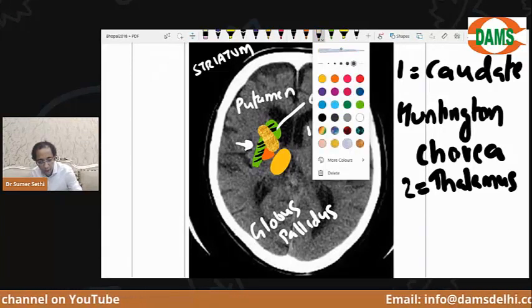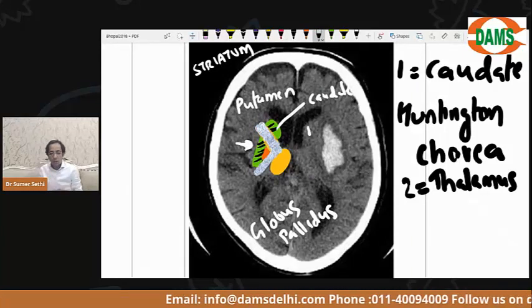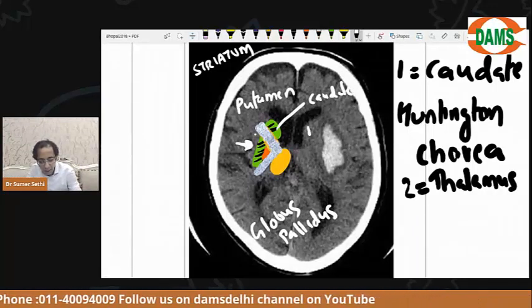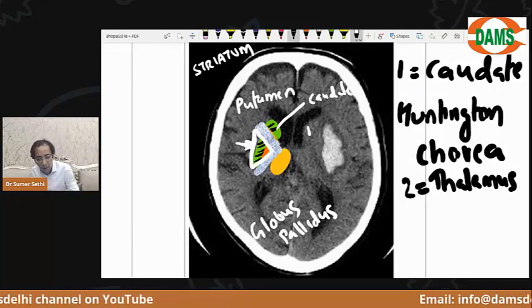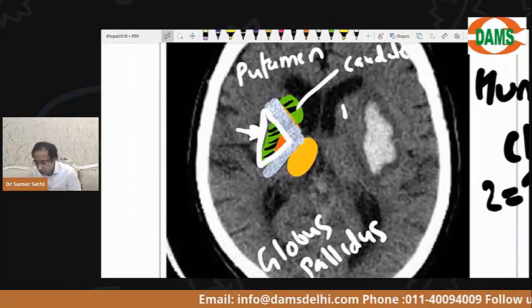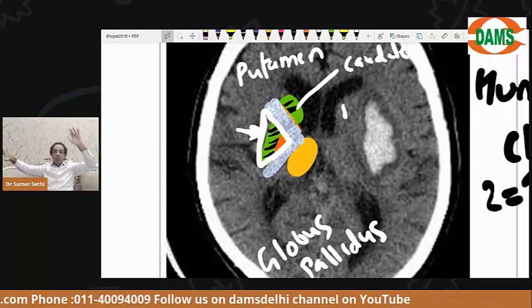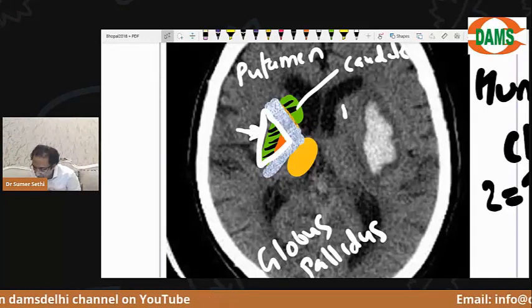Now I want some of you to quickly answer. जल्दी जल्दी बताना है. What is this between? ये क्या स्ट्रक्चर होता है बेटा? What is the structure which is between the caudate, the lentiform nucleus and the thalamus? इनके बीच में कौन है? इनके बीच में इंटरनल कैप्सूल है. इनके बीच में इंटरनल कैप्सूल होता है. Are you aware of this all? ये सब पता था ना? So the caudate nucleus, और इधर पे है लेंटिफॉर्म न्यूक्लियस, बीच में इधर थैलामस, बीच में जो ये सब Y के जैसे जा रहा है, that is the internal capsule.